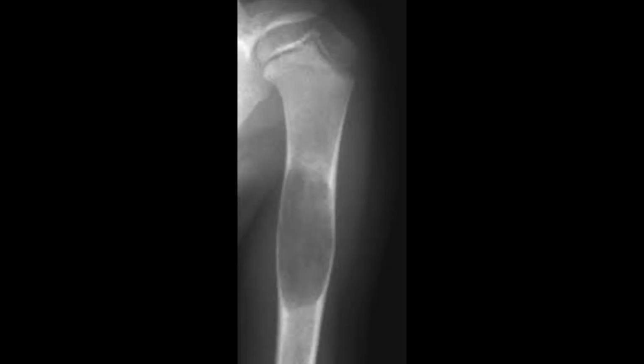As far as this humeral cyst is concerned, cortical expansion can be seen. It is well defined. It is centrally located. Cortical thinning can be seen. And the second thing is there is no internal matrix. There is no surrounding sclerosis in this case, and there are no fractures as well. So this is what a simple bone cyst is classically.